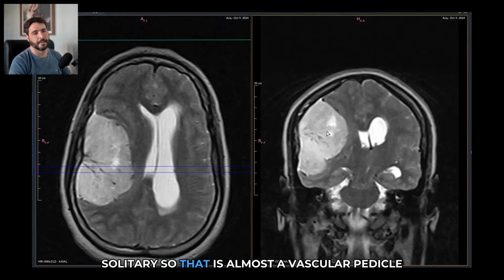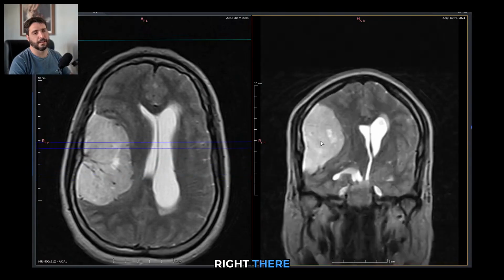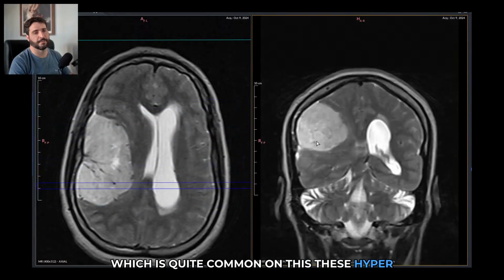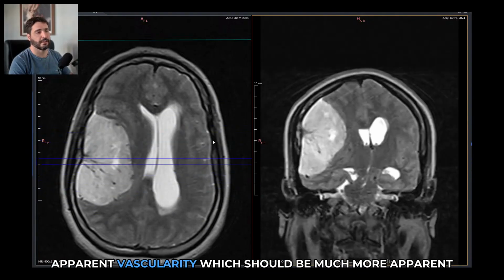So there is almost a vascular pedicle right there, which is quite common on these hypervascular tumors. It's mostly solid and it has apparent vascularity.